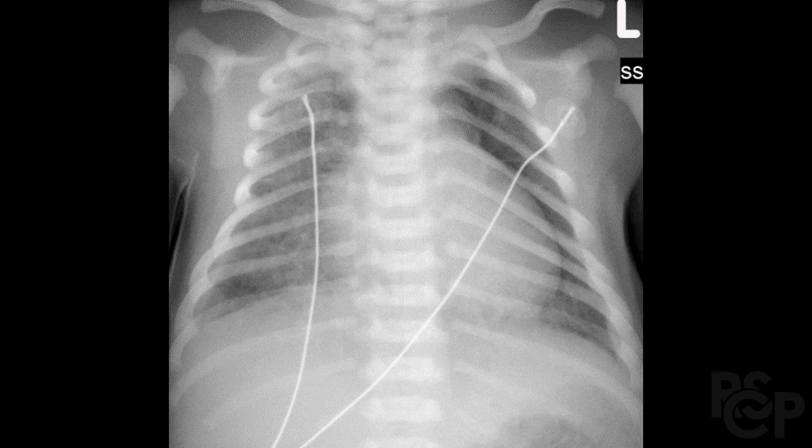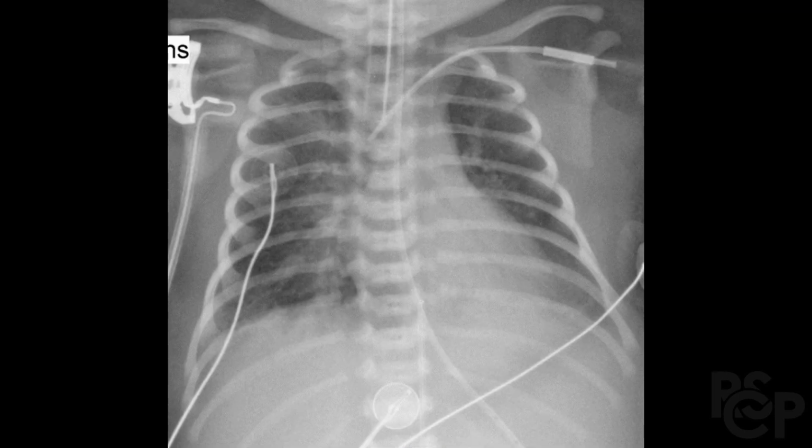And again, you really want to correlate the clinical findings with the radiological findings because this can get really confusing sometimes. Okay, so this patient is presenting with respiratory distress and is born at term. We start by identifying the lung volumes, which appeared to be normal. It's pretty hazy bilaterally. We see these patchy pulmonary opacities over here and over here. We don't notice any pneumothoraces on either side. And we can see the costophrenic angle here.